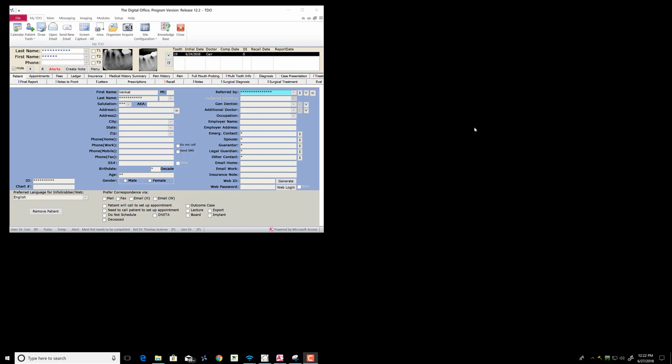Mike Trudeau had a recent recommendation today on some functionality in the image organizer, which the IO already has. So I thought I'd review this very quickly for people.